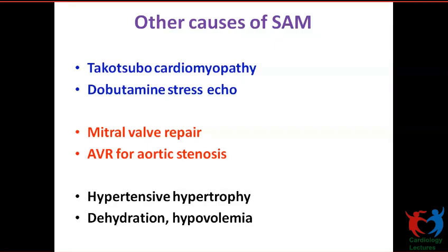It's difficult to understand. Anyway, you can read up more details. Causes of SAM, what is pseudo-SAM, acute LVOT obstruction. So hyperdynamic states can cause both SAM and pseudo-SAM, ma'am. How to differentiate on echocardiography? Pseudo-SAM coincides with the peak of the posterior wall contractility.